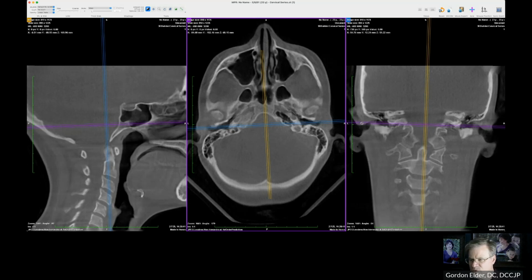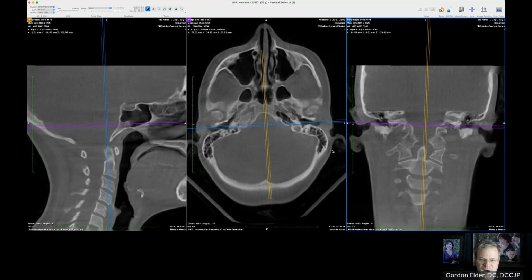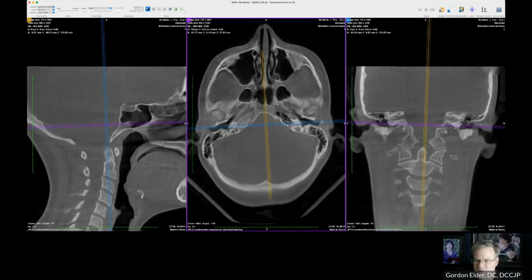These are temporal bone as well, of course, but closer to the foramen magnum. So if I'm going to need to pick which side of the EAM I'm going to measure, if they're very asymmetrical, different sizes, I'll typically pick the bottom. Otherwise, I'm really just kind of centering them in there. And you can see in the center picture here, the axial view, again, pretty centered. So this is going to be what I measure everything to: slope angles, convergence angles, and convexity angles.